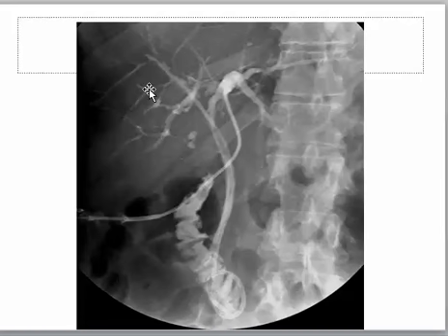Look at this. The biliary tracts are so thinned and as if splayed apart. This appearance is called narrowed biliary radicals. Narrowed biliary radicals can be seen in 3 cases. First, the cirrhotic liver. Second, metastatic liver. Third, the autoimmune liver and Budd-Chiari.